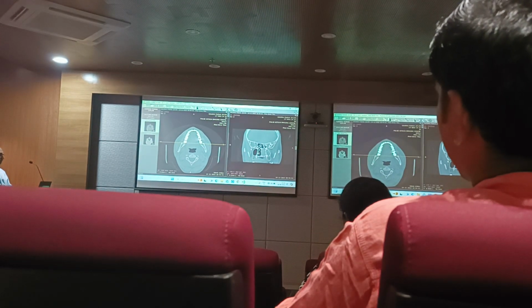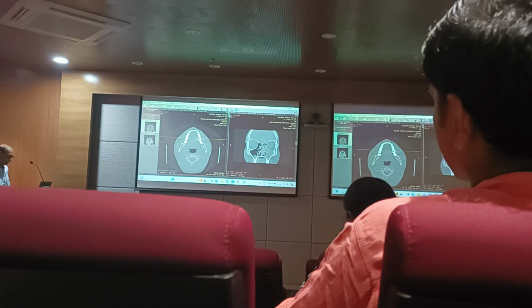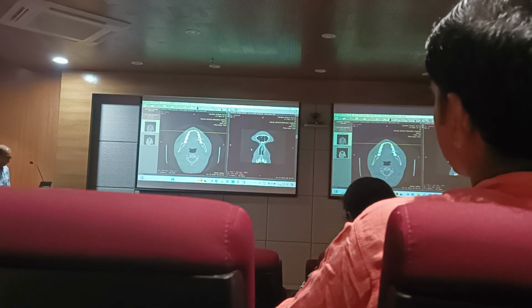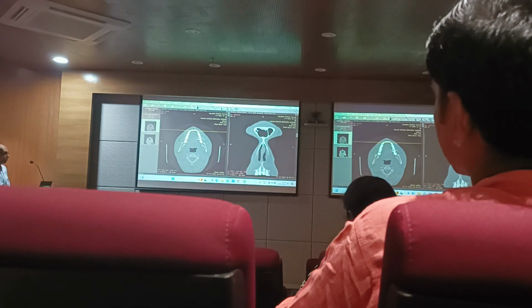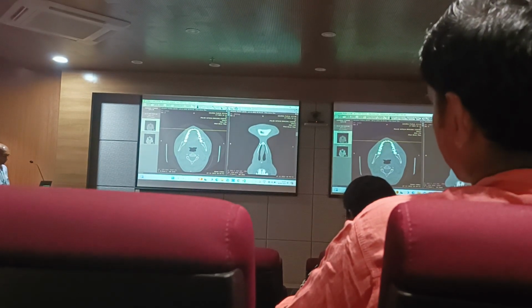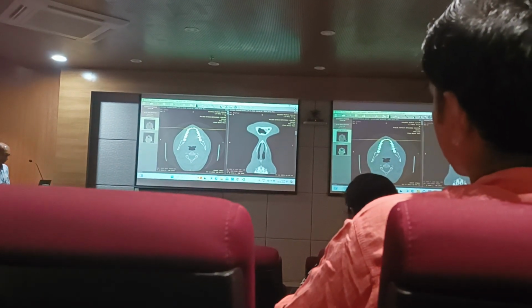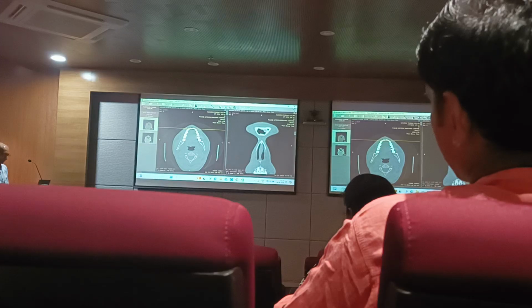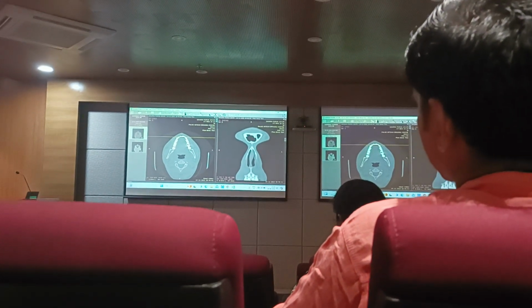So now I want someone to read this scan for me. I'm going to go front to back. Is it okay on the right side? Okay. So again, coming from the front, what is this? Frontal sinus. What is this? Nasal bone. Right side. Okay, good. What is this coming up here now? Crista.